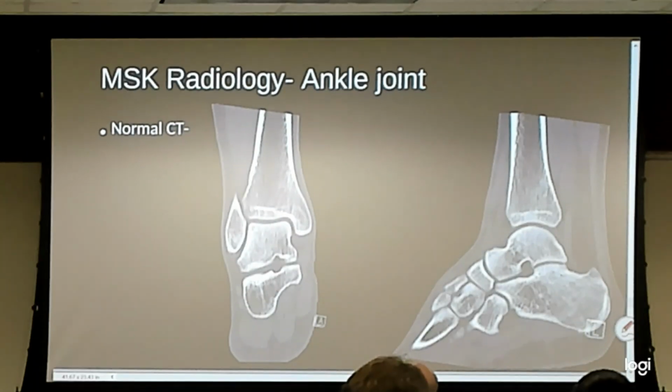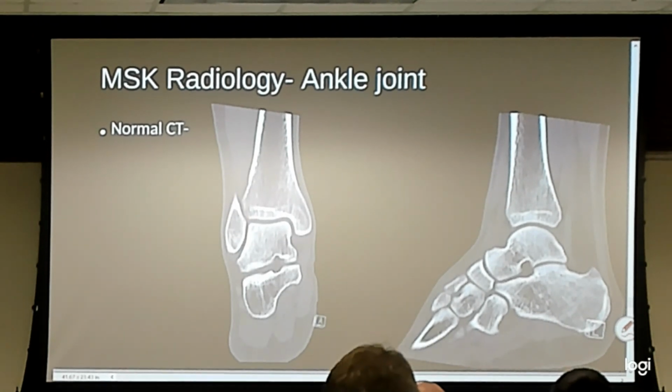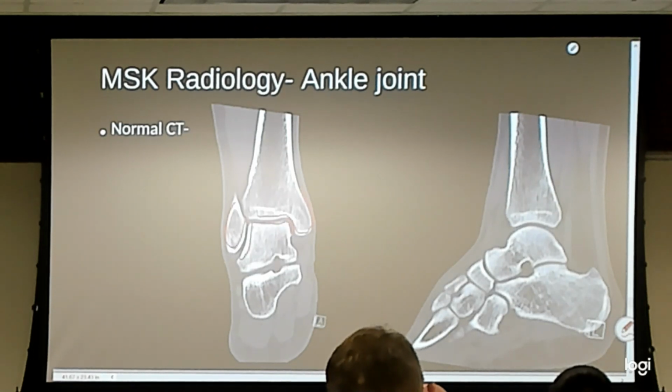Okay, CTs. We use these again a lot in fractures of the ankle for reasons kind of like we just saw. We could also be looking for loose bodies. That would be another good utilization of my CT. Those are really the ones I like the most. In terms of identifying structures, this one's pretty cool because right where they captured it, that's the medial malleolus, lateral malleolus. We've got that talus with the top of the dome, and this is all calcaneus.